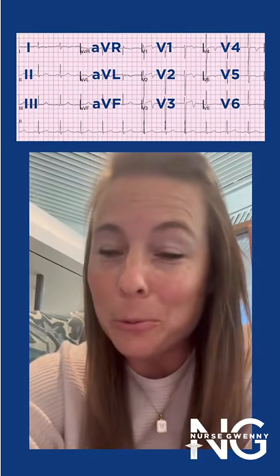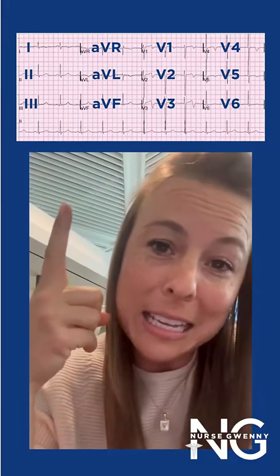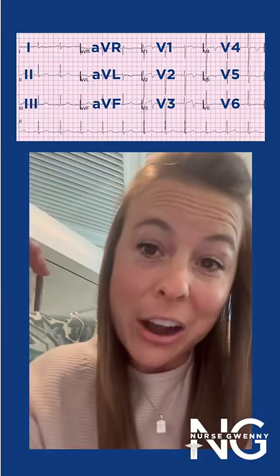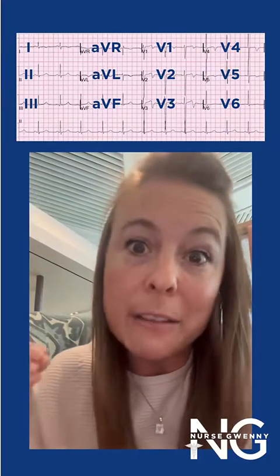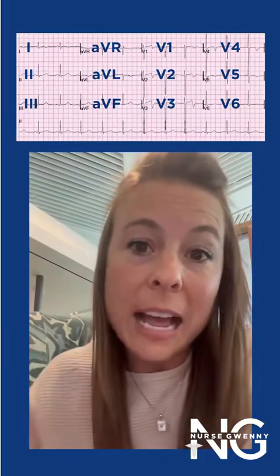Now, we have to start by knowing what leads are where on the paper. So if you look above, I have an EKG, and it shows you leads 1, 2, and 3. Then we have leads AVR, AVL, and AVF, and that stands for augmented vector right, left, and foot. And then we have leads V1, 2, 3, 4, 5, and 6.